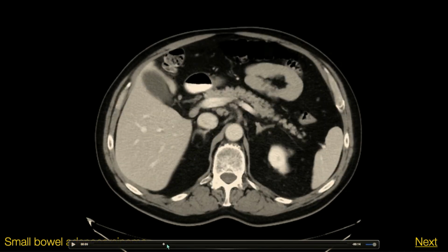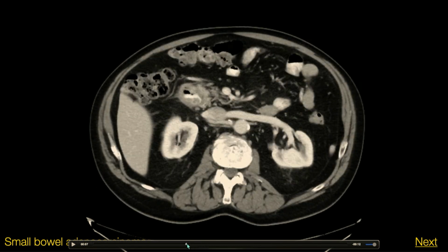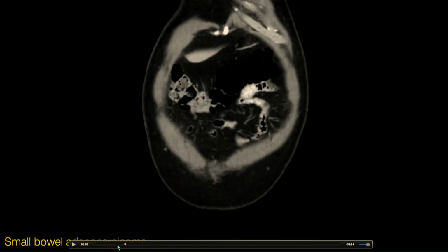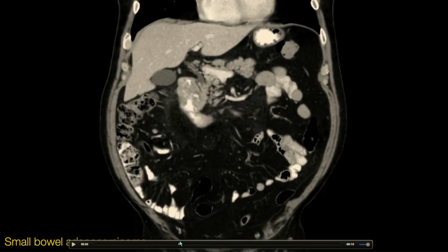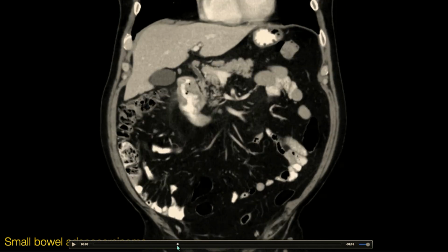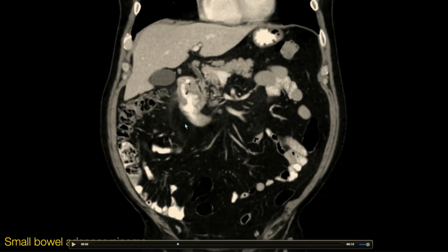Small bowel adenocarcinoma is not a particularly common diagnosis to make. Here we have an adenocarcinoma in the second portion of the duodenum. It almost has that similar apple core look of a colon cancer, right? It's this circumferential thickened wall and then some borderline surrounding lymph nodes. Just being aware of that diagnosis, notice the more intermediate or even higher density thickening of the wall rather than that low attenuation edema that we saw in the earlier cases of ulcer.